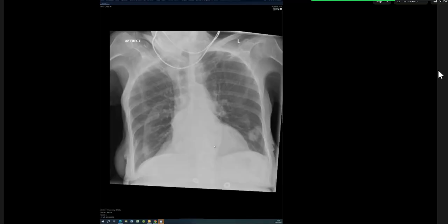So when I want you to approach a chest X-ray, I want you to pick all the abnormalities and start defining them. Because in the mediastinal one, you knew all the answers, but I had to ask you why for you to offer that information. You have to give me those points that you're checking through in your mind, because I don't know what's in your mind. I don't know what you know till you say it. So if I have to ask you why, you've already lost a mark. You need to explain your thinking while you're thinking it, because we think that it's rambling on, but it's actually giving a lot of insight into your thought process.